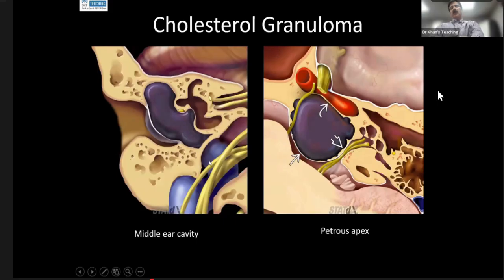It is very chronic, and I have read a study in the literature way back where they had documented a cholesterol granuloma developing over 22 years, because they had serial imaging. What happens is that it keeps bleeding within the lesion, so part of the high signal is hemorrhage. Part of it is cholesterol crystals. That is the concept, and it will cause expansion. So it's a unique type of chronic inflammation. The radiology is Aunt Minnie radiology.